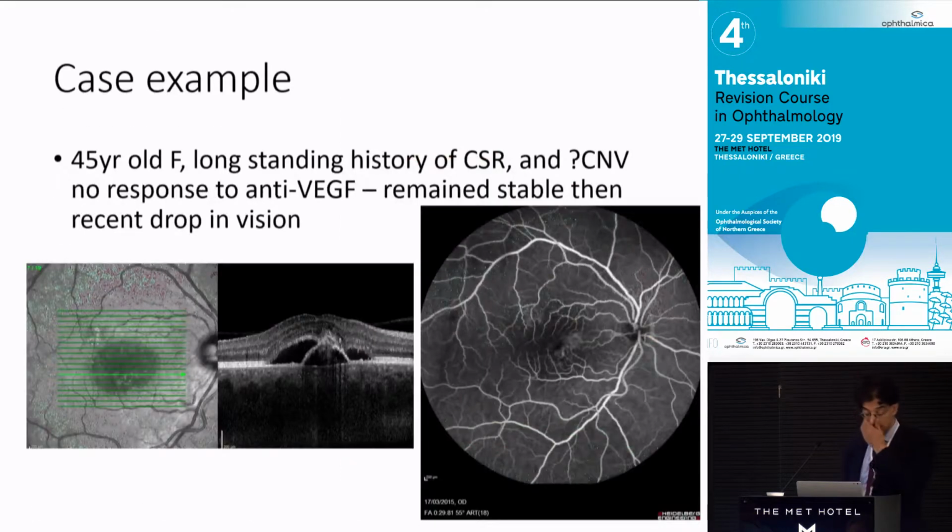Okay, so this is an example of a patient where I think OCTA is particularly useful. This is a 45-year-old patient who had central serous chorioretinopathy, was previously injected elsewhere with no change, because they originally thought it may have been a CNV, but it made no difference, and it was actually CSR. But then the patient had another drop in vision. And this was the OCT here, and you can see what looks like a serous PED, but there's kind of this opacity in the outer retinal structure.